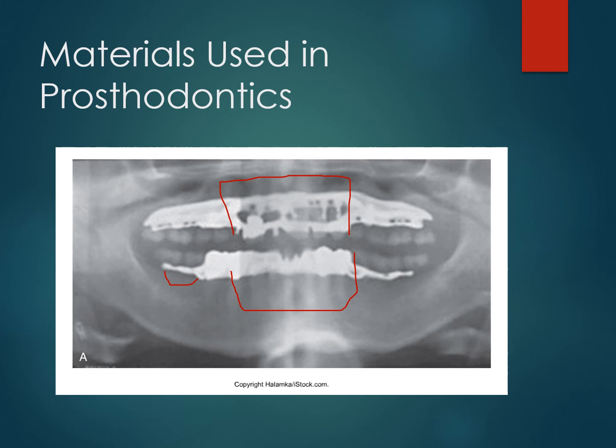Also, again, it looks like they didn't have this patient stand up straight when they were going into this image, and so it therefore bumped into the back of their neck. This is actually really common for older individuals, especially if they are missing a bunch of teeth, they have dentures or partial dentures. They're probably a little older, hopefully, fingers crossed, and so they probably have a harder time standing up straight. And so this is a very common error for panoramics on older individuals, but still an error.